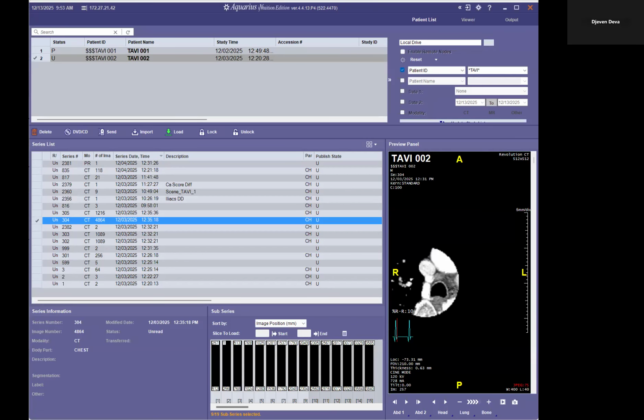Okay, we're going to explore the concept of peak annular distension in this case. I know, having checked earlier, that end-systole is at 45 and diastole is at 95. So we're going to load our early systolic phases up until the end-systolic phase, which is 45 over here, and load these to our TAVI1 workflow.